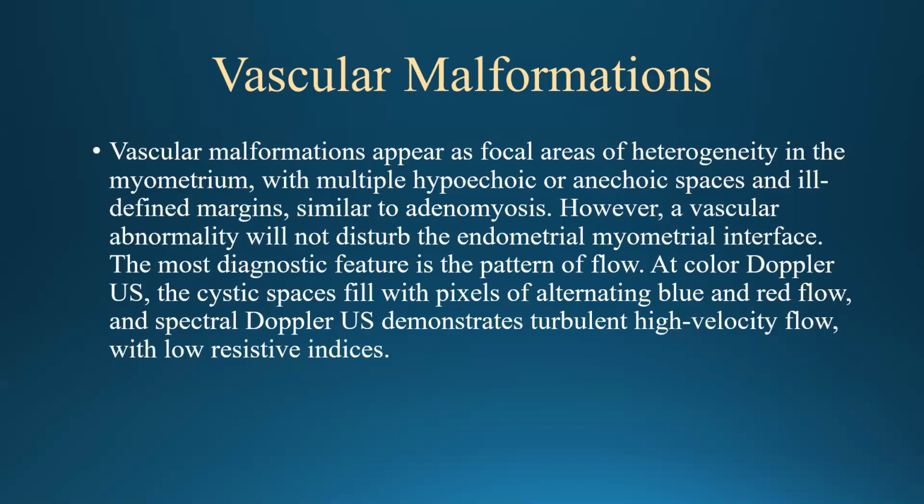However, a vascular abnormality will not disturb the endometrial myometrial interface. That's the key word here. It's there, but it will not disturb the endometrial myometrial interface. And the most diagnostic feature is the pattern of the flow. When you put the color Doppler ultrasound, you would find that the cystic spaces fill with pixels of alternating blue and red. When you have this alternating blue and red flow, and the spectral Doppler demonstrates turbulent high velocity flow and a low resistive index, this is indicative of a vascular malformation, not an adenomyosis.